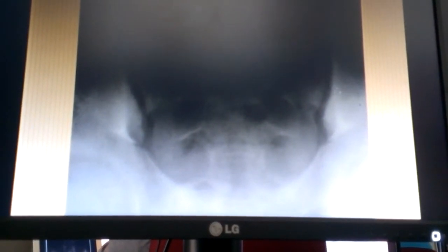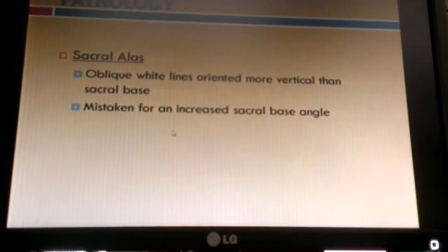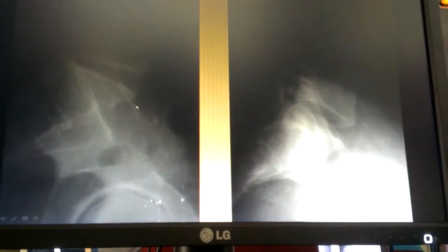In the female, you get what Dr. Thompson will call osteitis. Don't write this down. This is not on the test. Osteitis condensans ilii. The sacroiliac, you know where that is. But on the lateral, right, it's this area here that's adding density. And these, I don't know that you need to know what those are.